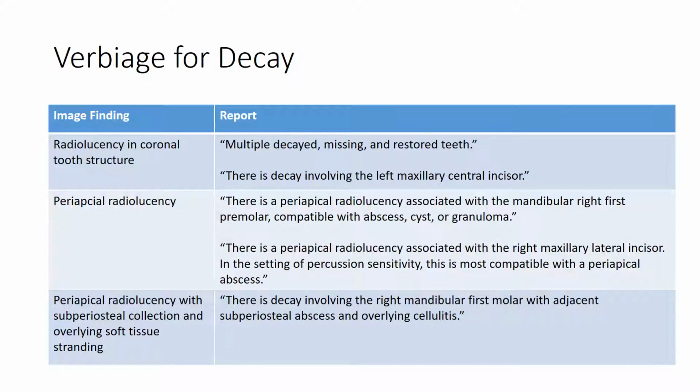You can word it like this. There is a periapical radiolucency associated with the right maxillary lateral incisor. In the setting of percussion sensitivity, this is most compatible with a periapical abscess.